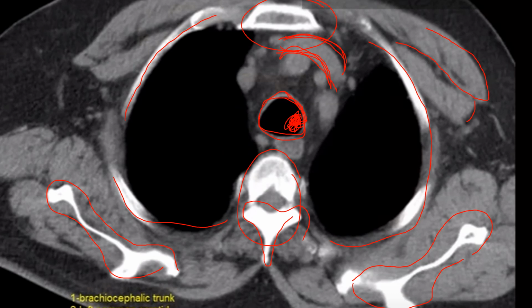Or if you see a bunch of coin lesions, you would see them up here. But most often, remember, coin lesions or lung cancer or things like that happen in the right upper lobe more than the left upper lobe. So that would be, remember, it's a mirrored image. So which lung is the right lung? Yeah, this is the right lung. This is the left lung. Okay, so remember, it's a mirrored image.